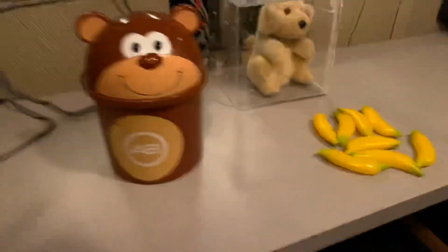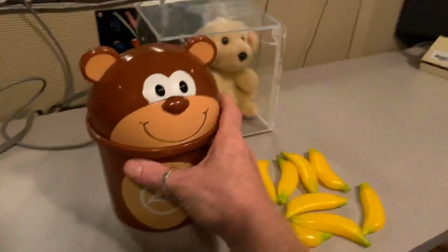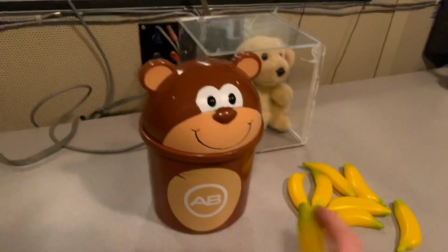Next thing we're going to talk about is play audiometry. Visual reinforcement audiometry is good for children up until about 2.5 years old. From there, we have to do what's called play audiometry. This is fun. I like play audiometry, but sometimes I don't either. It depends on the child. This is where children can be very difficult, as you might guess. But what we do with play audiometry is I condition the child with the help of the parent to hold some sort of toy or something at his or her ear and wait for the sound, wait for it, wait for the birdie, tweet, throw it into the bucket, okay?